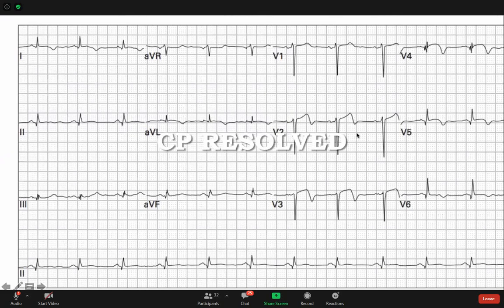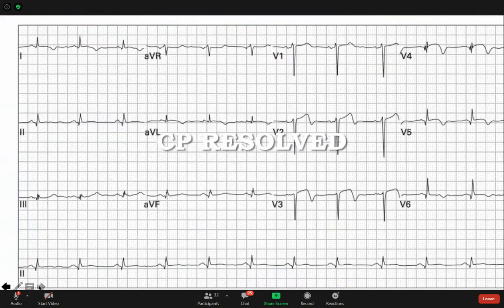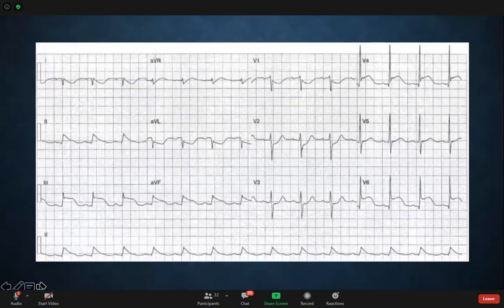شوف شيء غريب في الاس تي سيجمنت؟ هل في ستيليفيشن؟ لا ما في اس تي ديفيشن ولا ستيليفيشن. Yeah, T wave قلنا we're not gonna discuss it. Okay so this is a little bit advanced ECG. This is Wellens syndrome so I'm not gonna explain it to you لأني ما بلخبطكم. But this is عادة I give it to the residents, it's fine. طيب هذا ال ECG لا هذا both were too difficult. شفت، it wasn't very hard. You got it.